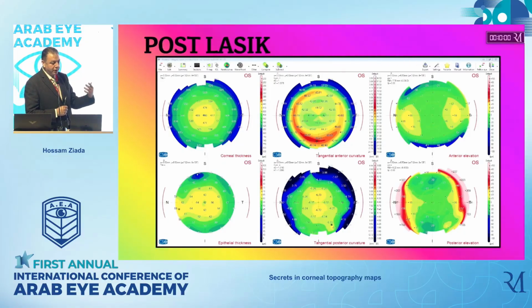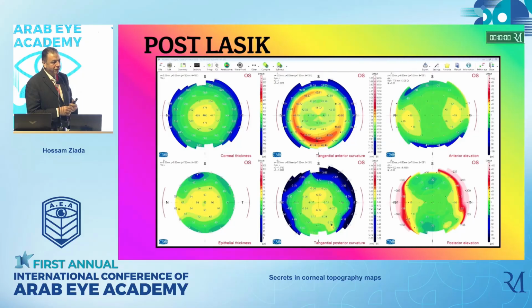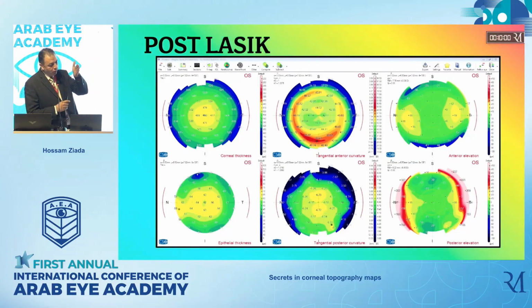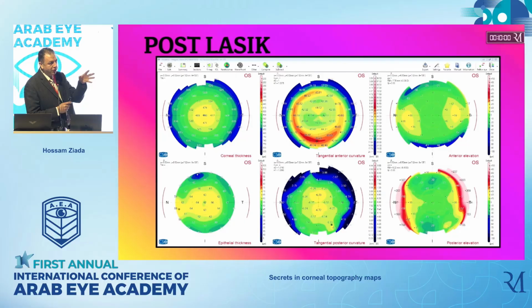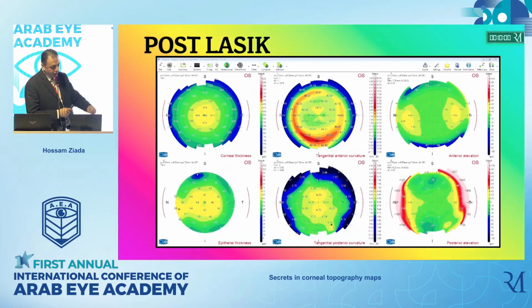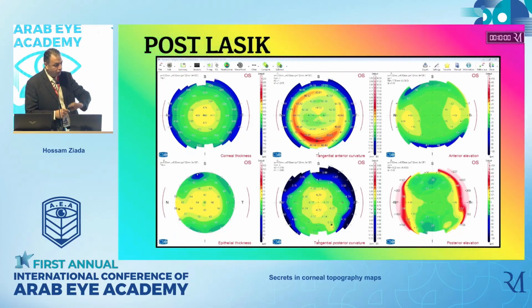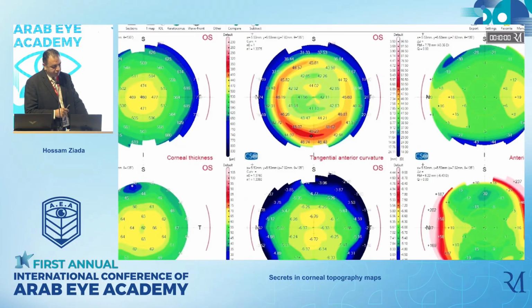If I did any epithelial mapping for patients, especially the myopic patients, surely I will find epithelial thickening in response to healing, to compensate for the steepened part with the flattened part from the ablation. There is some part of compensation of the epithelium, so there is epithelial thickening, which may act as a convex lens on the corneal surface, giving a myopic error. So this is a different calculation regarding the redo. Look here at this patient, very thick epithelium, so no ectasia at all, but there is epithelial thickening and hyperplasia. It's more obvious in the next slide.